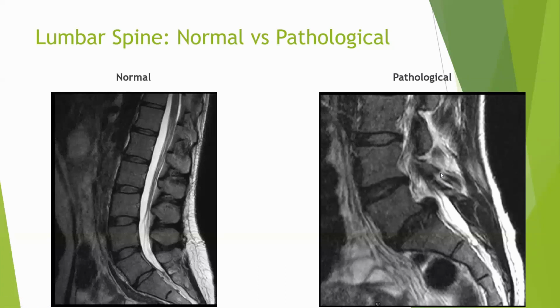Now, long story short, there is not much complexity in reading orthopedic or spinal MRs, right? Nerve root, discs, disc health, vertebral body height, intervertebral disc height, facets, foraminal diameter. So these are the things that you will look for in a lumbar spine MR. It can be your cervical spine or your lumbar spine or even thoracic spine. So these are the only variables or factors that you are going to look at and try to analyze.